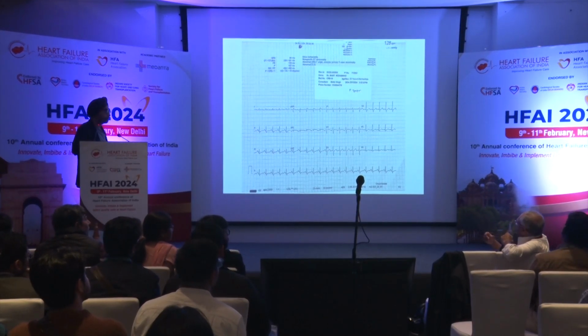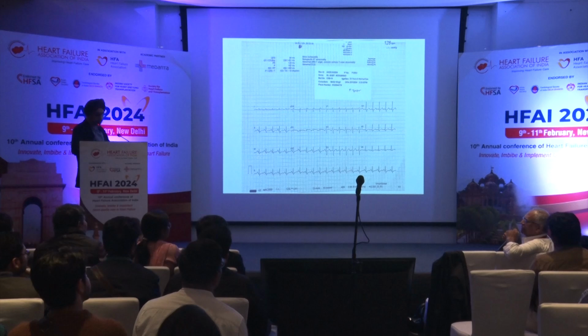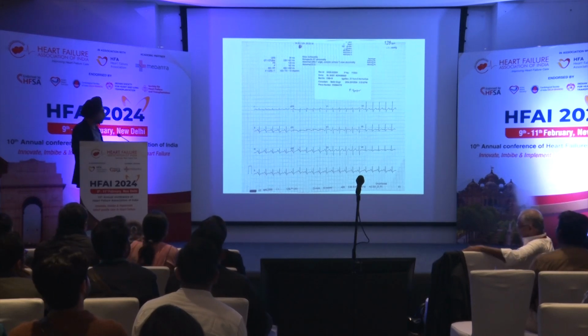properties. And the very interesting thing is V1 is upright, V2 is again a pattern break. You see V1 is upright, V2 is inverted, again V3 becomes upright. So what it means is the tachycardia is coming from a structure exactly where you place the V2 lead. The V2 lead where you place in the chest, what is the atrial structure underneath that? You look at the topography, I think it should. Sure, you know.